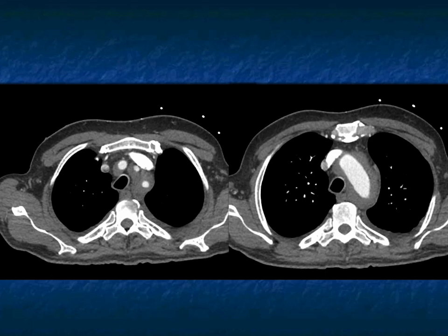So what could this be? It could be retroperitoneal fibrosis. It could be fibrosing mediastinitis with infiltration. You got to think, could it be lymphoma just infiltrating the areas? Those are all good thoughts. But I still want to make certain I'm not dealing with an intramural hematoma.